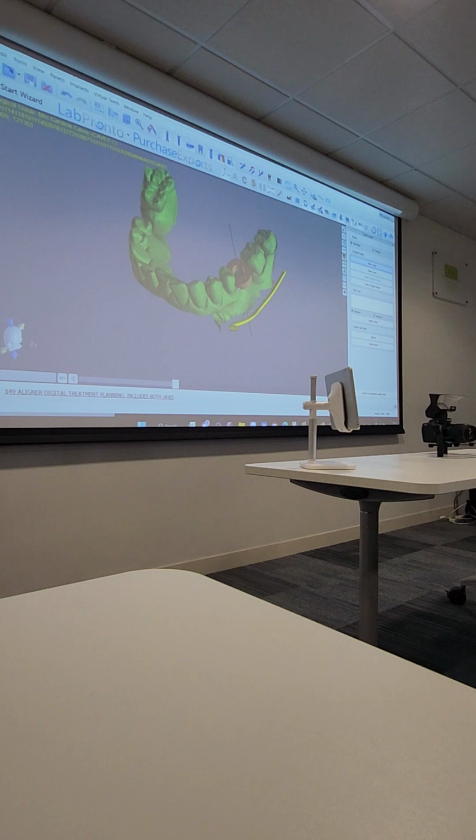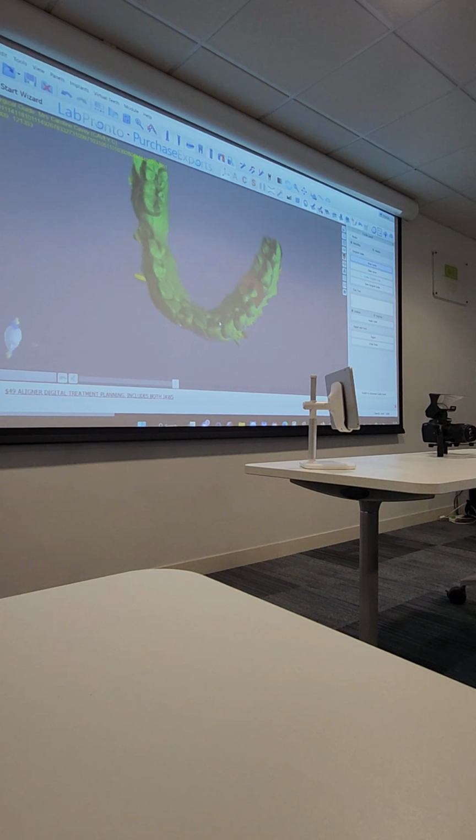Press once, it puts a dot down. You move to the next place, next tooth. Make sure you don't go underneath, undercuts. Just keep to the buccal surface, do another dot. Here, I want it to rest on the soft tissue. Here, I'll go back to the teeth. And I'm going to extend it, say to here. There's nothing right or wrong, okay? You can say longer if you want. You don't want to go too long though.